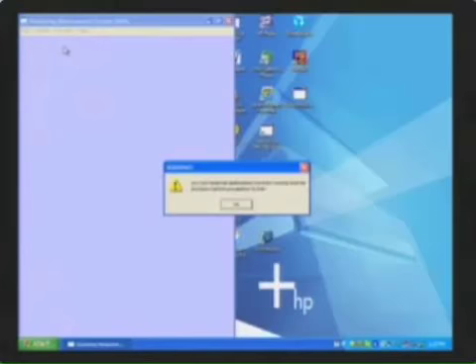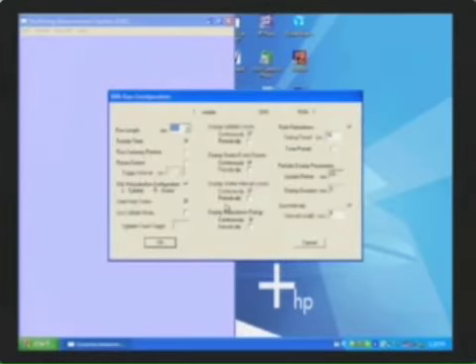Notice that a warning appears reminding you that no other programs should be operating while you are using the SMS. After all other applications are closed, click OK, which will advance you to the next screen of the SMS called the SMS Run Configuration screen. The functions of the other labels on the top row are described in the appendix.